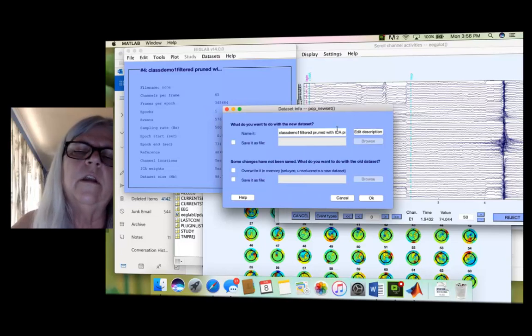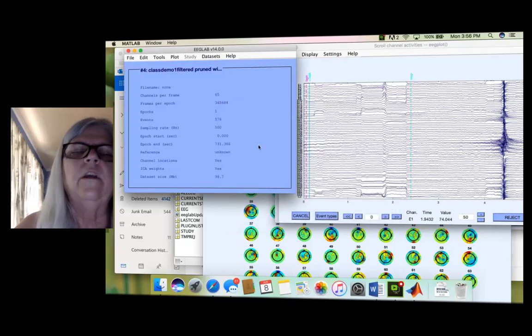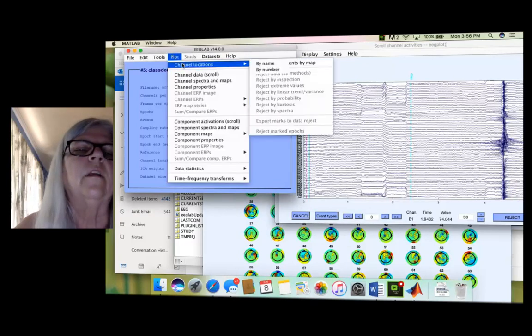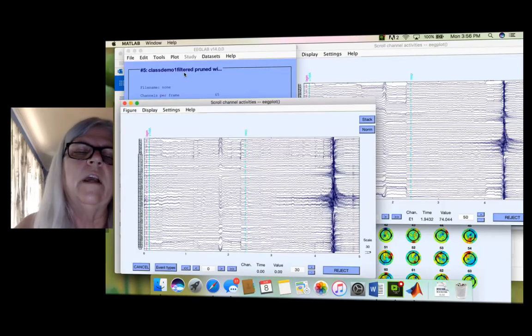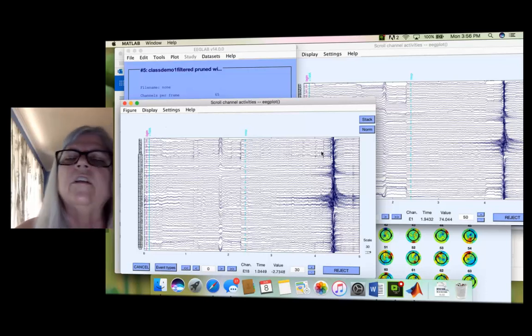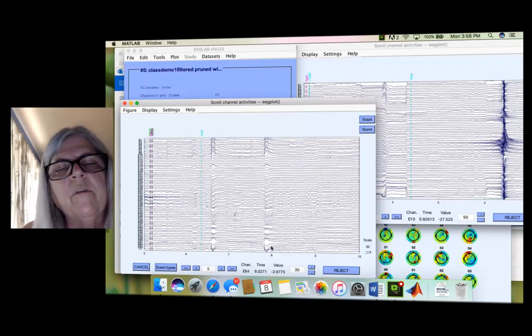Okay. And let's call this version 2. Okay. And now let's plot again. Okay, and now notice, I've now made a significant difference. You note that these little plateau-like tabletop things are mostly gone. I still have this guy, he's a mess, but they're mostly gone. These guys are still hanging around a little bit, so probably I missed a component somewhere.